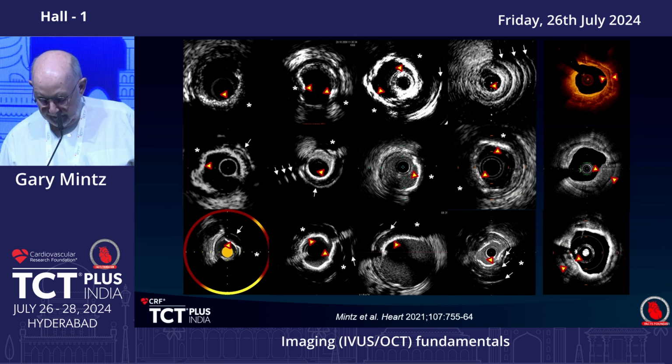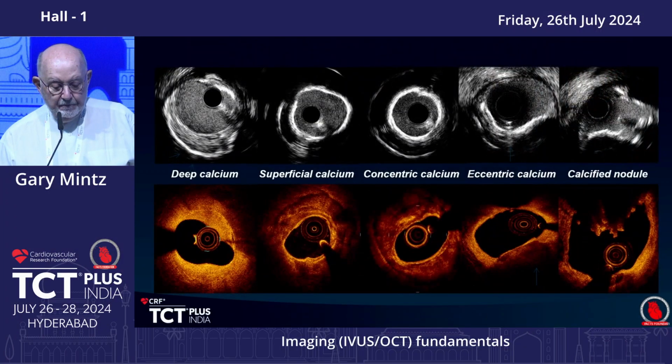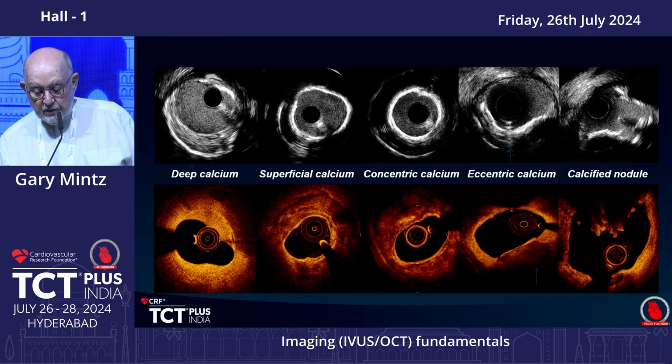And again, comparing IVUS and OCT, here is deep calcium by IVUS, deep calcium by OCT, that's kind of hard to tell, superficial calcium by both, concentric calcium by both, eccentric calcium by both, and a calcified nodule also by both.